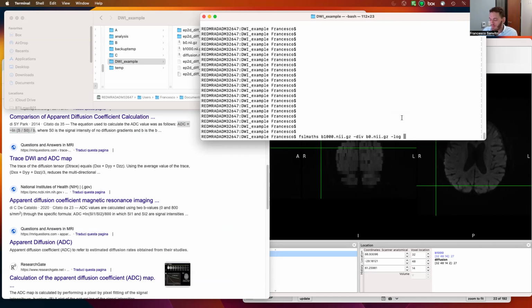Then, let's put the minus sign that we haven't put yet, so let's multiply by -1. It's just like putting a minus sign. And then we have to grab this whole thing that we created and divide by b. Divide by 1000.